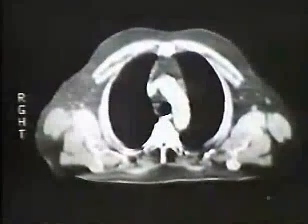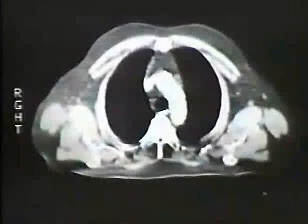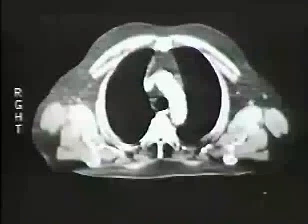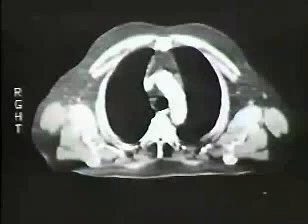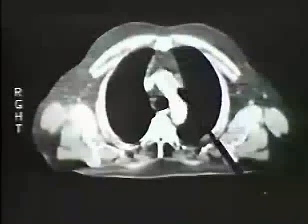Looking at a typical CT scan in a patient who is reasonably well endowed with fat so that we can see the structures pretty well, someone who has been given intravenous contrast material so that the aorta and the superior vena cava are quite well marked. The aorta is obvious here. Notice that the superior vena cava shadow runs right into the aorta. This is a consequence of the partial volume effect.